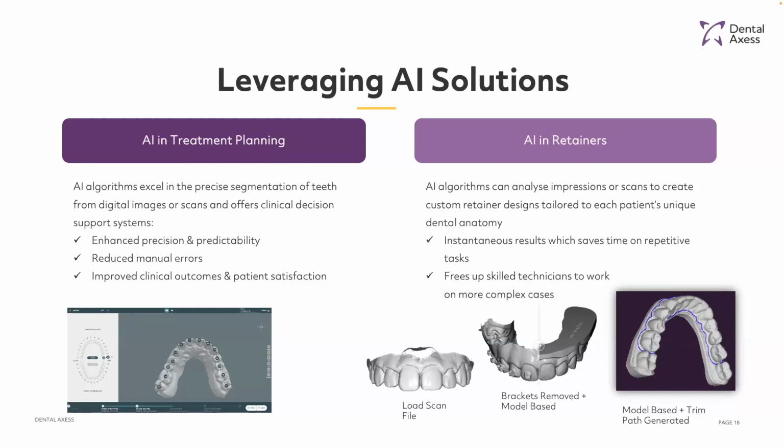Now, one remarkable application of AI is in retainer designs, and I know one of our audience actually uses it at the moment. But by simply uploading a dental scan into Xflow, within minutes this AI algorithm will perform a range of tasks. So you can remove your brackets within minutes. You can base a model for 3D printing, also based on your attributes and what kind of settings you'd like to place on the model itself.